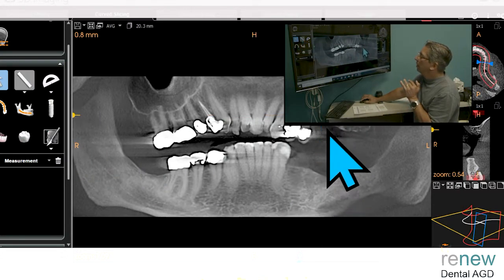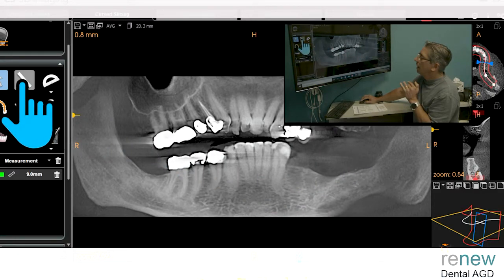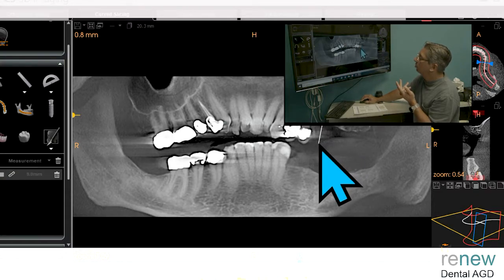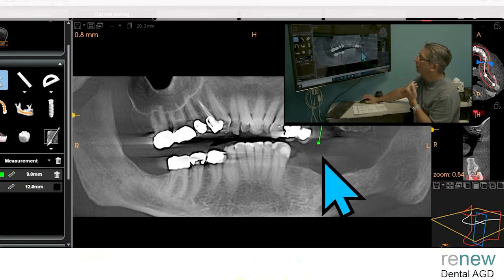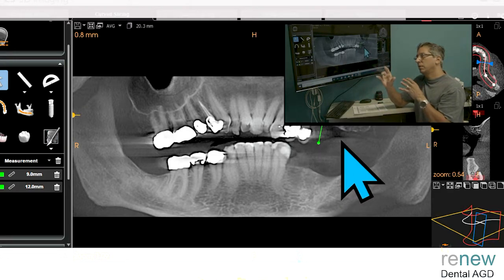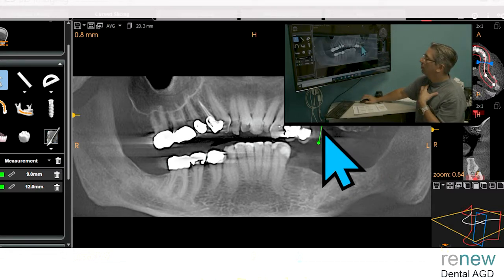Your implant will be here, and you're looking at having, let's say if you did the 10, your coronal portion is probably going to go out to about a 12 at least. So this is where the implant to crown ratio is a little bit top heavy, but not too bad. Should be okay. The lower, like I said, we're going to talk about that more.